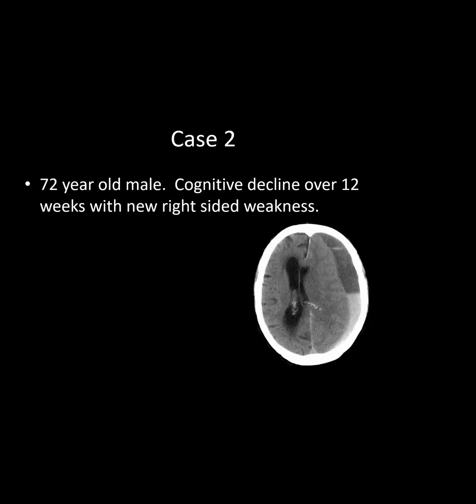Okay. So take a look at this case, and it's pretty basic, but they've shown hemorrhages on your in-service in the past. So just tell me what you see on here. So this is CT without contrast. On the left supratentorium, there's half hypodensity, half hyperdensity. So I think what happened is probably this patient has a chronic subdural, acute on chronic subdural.